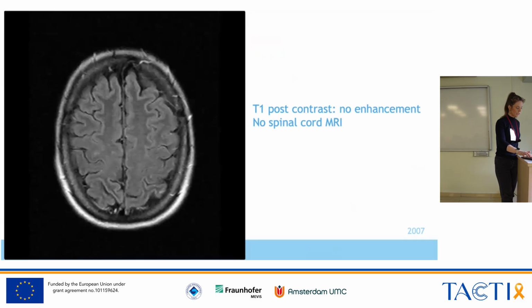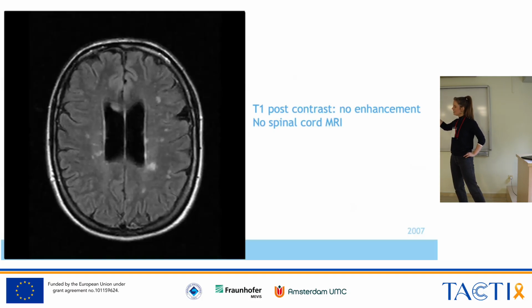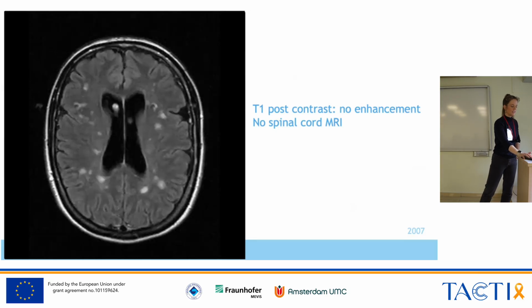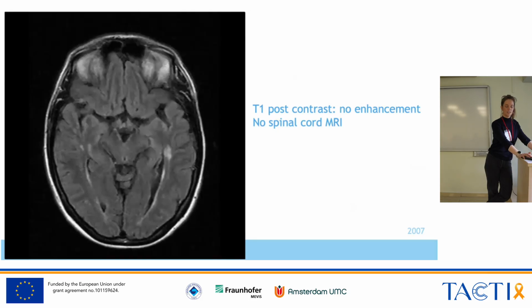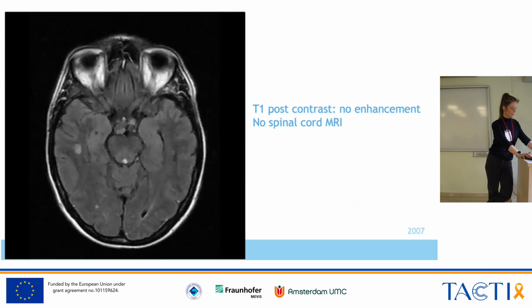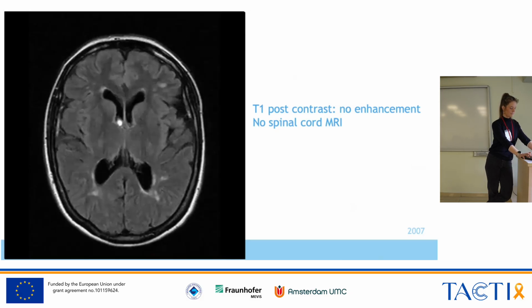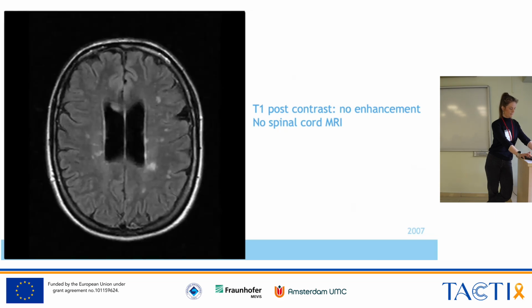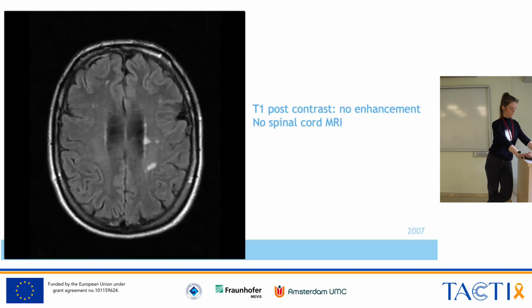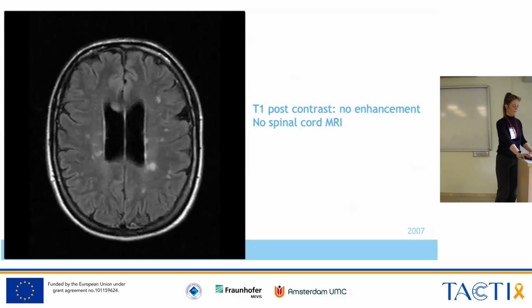So now we're slightly moving into the more expert scans. What do you think of the localization and the morphology of the lesions that you see here? Is there anybody who dares to comment on this? She's 49. Oh, and she smokes. What do you think, Farah?